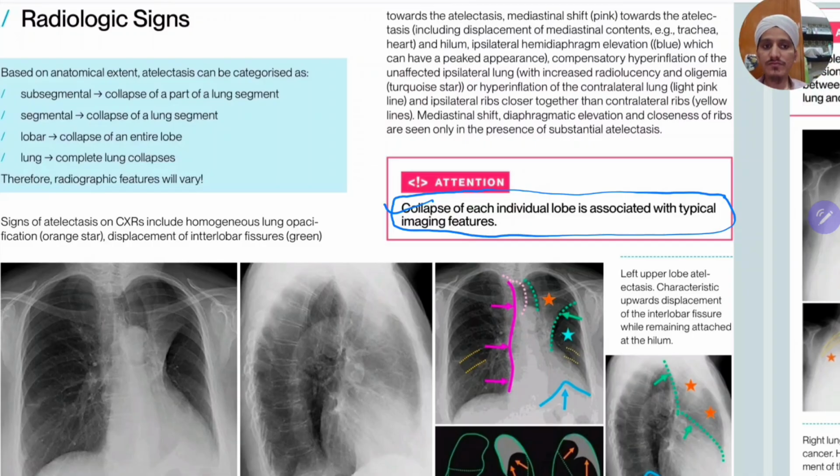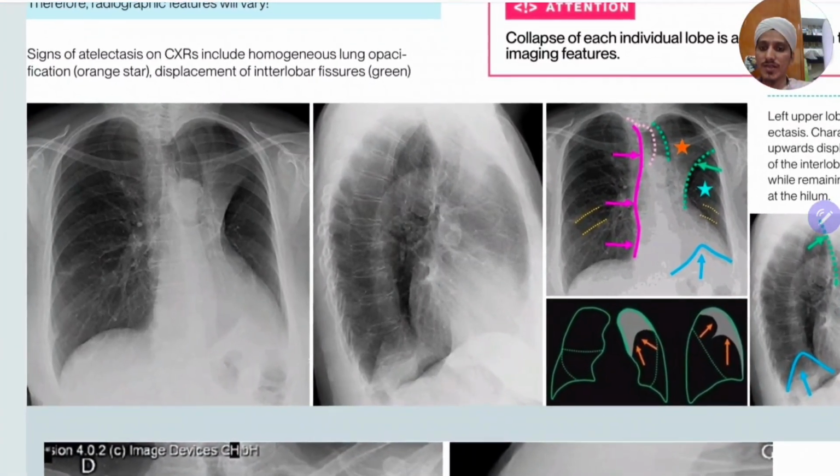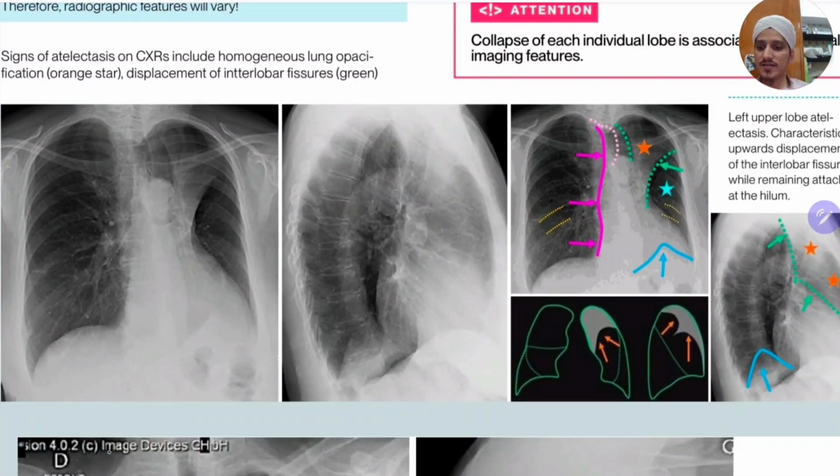Okay. Same thing is explained here. So now we will see the X-rays. See this X-ray. So first we'll see this. Here, this is the trachea, and the clavicles are equidistant and just visible, so there is no rotation, and the ribs are also okay, 5 to 6 ribs.